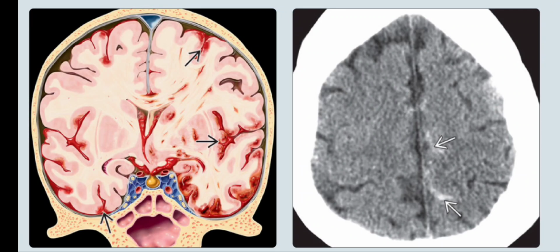So this left image is the coronal graphic, which seems to be depicting the findings in severe traumatic brain injury. This is a closed head trauma case, and it has resulted in multiple gyral contusions and subarachnoid hemorrhage. Most traumatic subarachnoid hemorrhages occur adjacent to the parenchymal brain injuries, and they are found centered around the sylvian fissures, the inferior frontotemporal, and the convexity sulci.